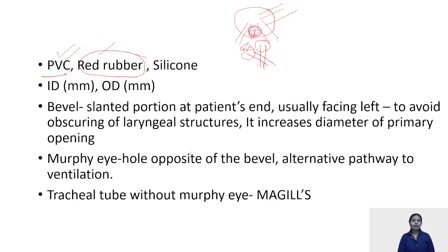Done. Second, Murphy eye, and without Murphy eye we have Magill's tube.